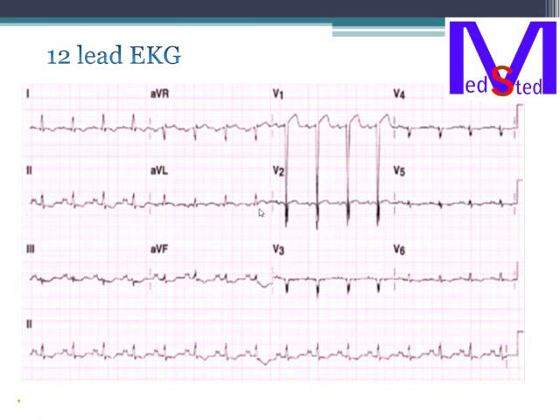Let's look at the P waves in leads 2 and 1. In lead 2, the P wave is seen clearly in the shape like M. The notch of the M in P wave is greater than 3 little boxes. The M represents mitrale, a disorder of the mitral valve. It may represent mitral regurgitation or mitral stenosis.